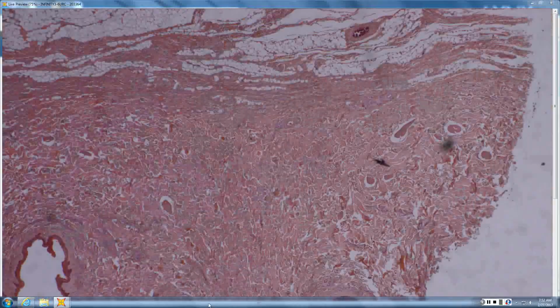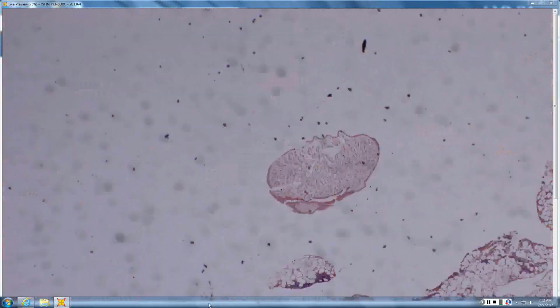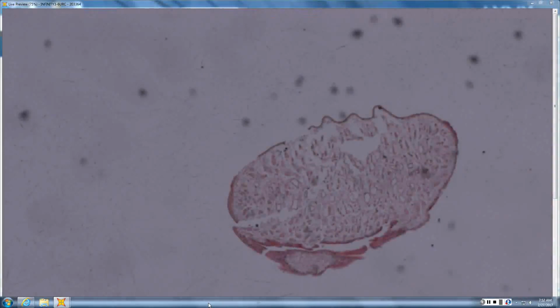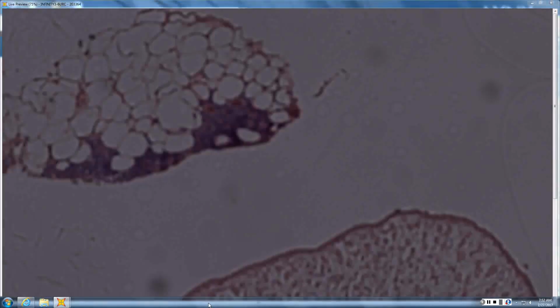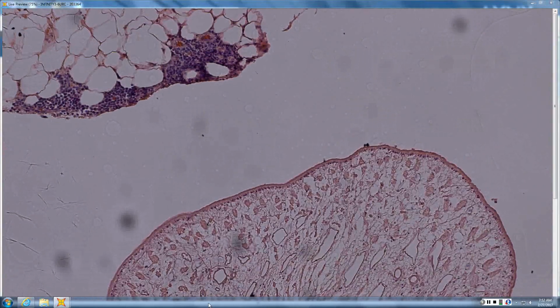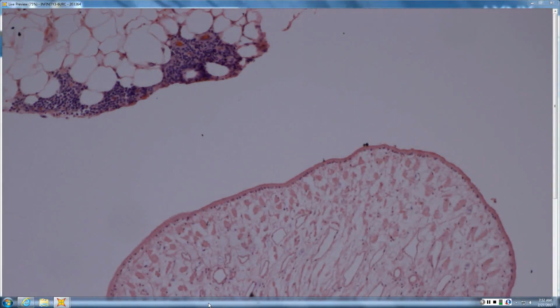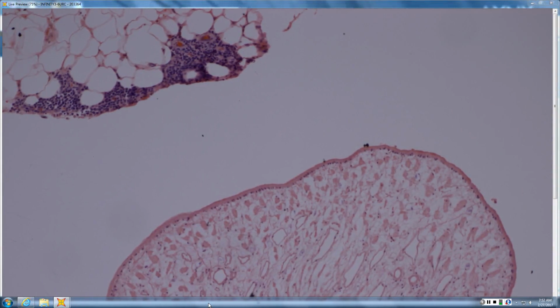So, skin, muscle, and because these are your favorite, what's in the worm? Fat. So this worm does not have a gut. This worm has a tegument with subtegmental cells. Smooth muscle, basophilic calcareous bodies. Yeah, so I would say sparganum. It's a flatworm, not a roundworm. In practice, if you got that far, you're doing pretty well.